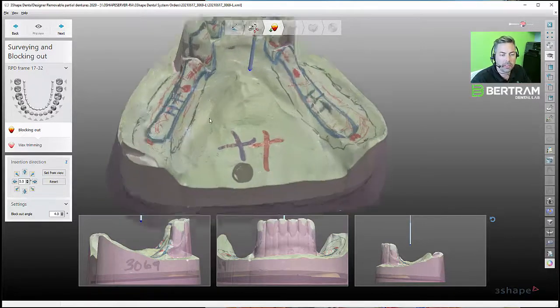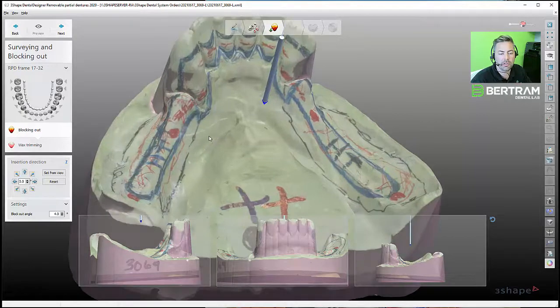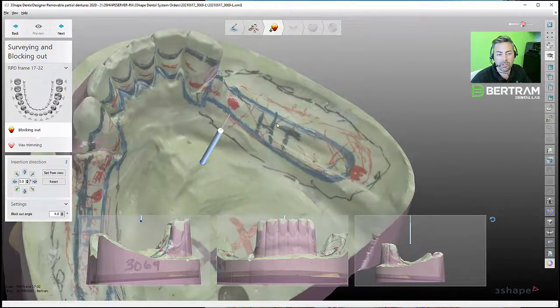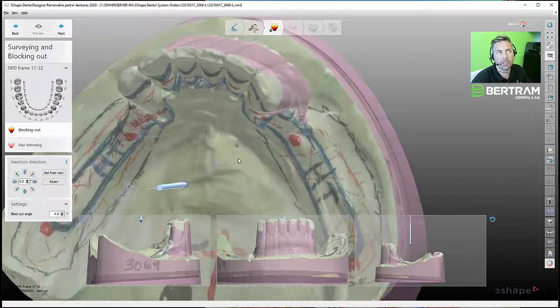We've got something unique here today. Now that we've hit a lot of the basics, we'll start venturing into some more unique cases and show you some of the design things that we do internally and what those mean. For example, on this one, we have the two posterior saddles, and you'll see an H and a T. To us, that indicates heavy and thin. So in CAD, we have to translate that over from the analog world. And we know from previous videos that heavy equals 0.8 and thin equals 0.4.